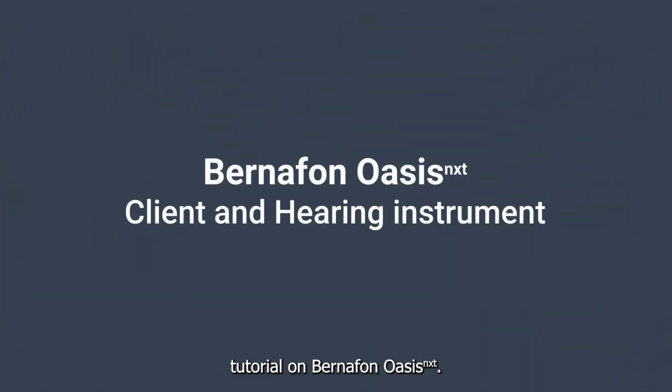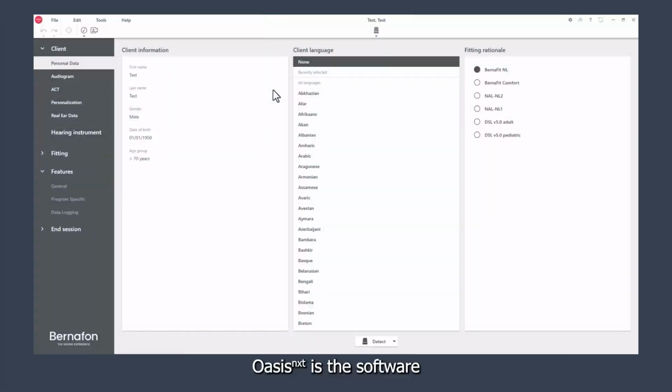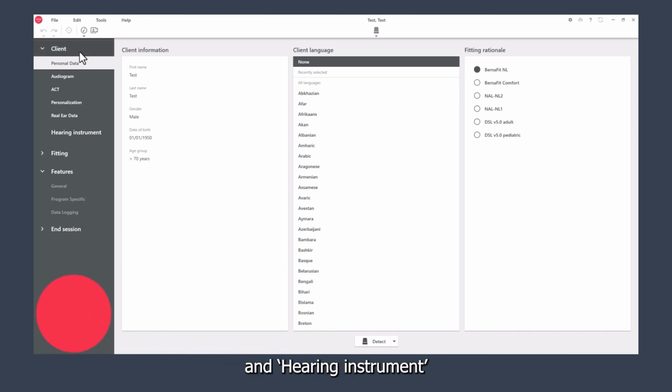Welcome to this tutorial on Bernafon Oasisnxt. Oasisnxt is a software which you need to program Bernafon hearing instruments. My name is Chris. Today I will take you through the Client and Hearing Instruments section of Oasisnxt.